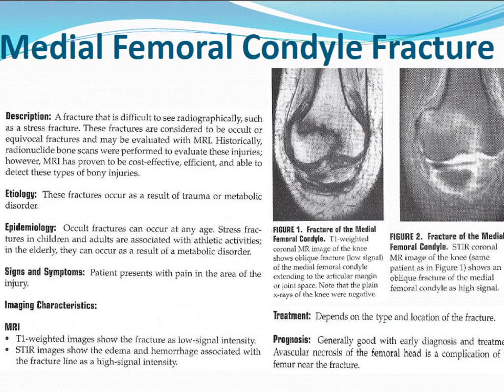So this is just showing a fracture of the medial femoral condyle, and this is something that, unlike many fractures, we may not be able to see on X-ray. They can be quite subtle because there's not really a separated fragment that comes apart, where you can see an edge, a line that we would see on X-ray. So they can be really subtle.